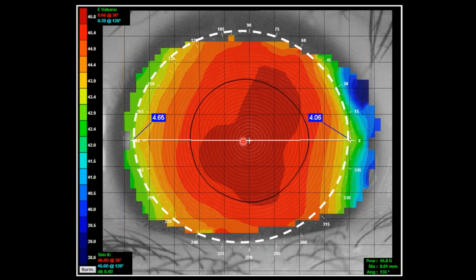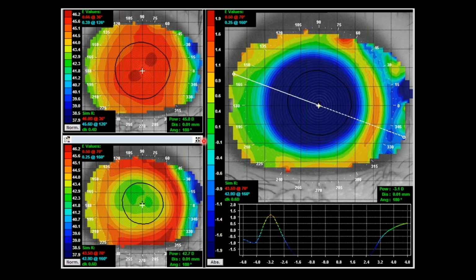So there's a slight displacement of the corneal contour to the temporal side in relationship with where the visual axis is. So we would expect our lens to be slightly temporal of center. Now, not too bad. Wouldn't expect the outcome to be severe, but just something to keep in the back of our minds. When we see the post-treatment topography, do we notice the lens treatment zone or lens centration following the natural displacement in relationship with the visual axis?